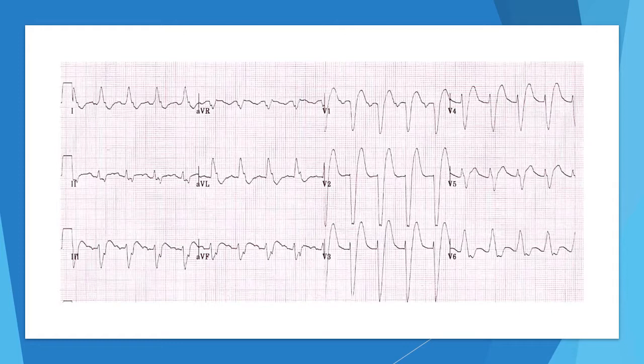Also, I want to stress that I do believe it's important to fundamentally understand why these ECG presentations manifest in this type of pattern, and that we don't just learn little tricks. I've heard a couple of tricks about trying to learn bundle branch blocks, and none of those are 100% accurate, and you're going to miss stuff, you're going to misdiagnose stuff.